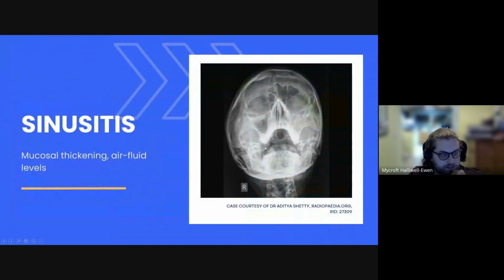Now, sinusitis, right? Again, not something we always diagnose on X-ray. Usually we diagnose it clinically. Something that's really quite common, but can be really quite debilitating and can be life-threatening because frontal sinusitis can develop into subdural empyema, so, you know, intracerebral abscess or pus, and maxillary can go into orbital cellulitis, which can then track back as well. So actually can be quite dangerous.